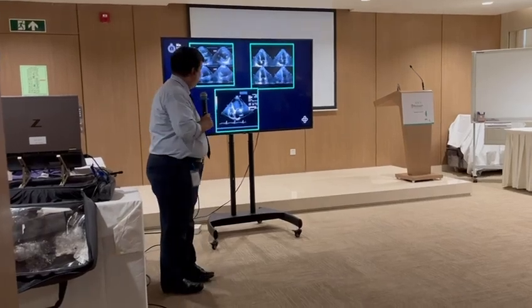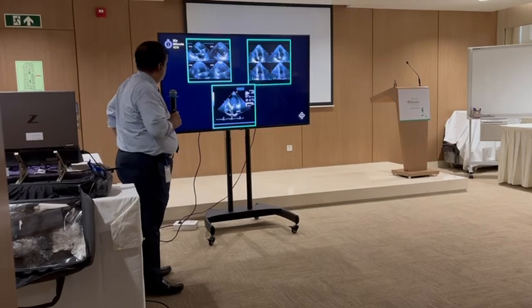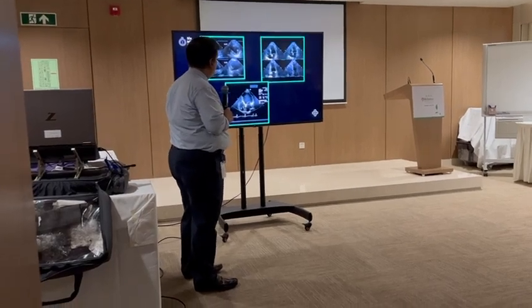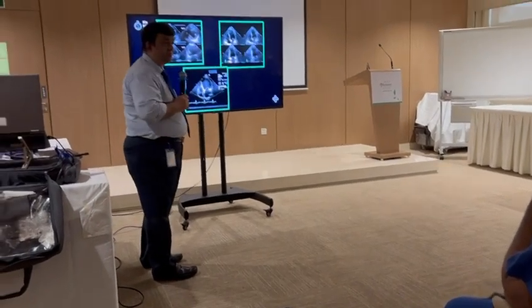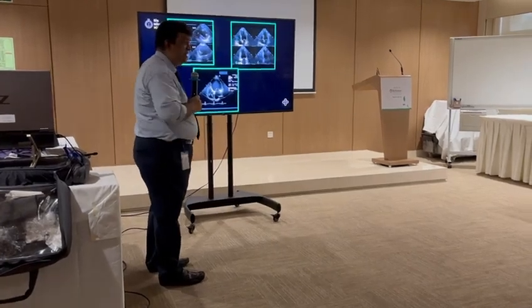Okay, tell me. This one, good, moderate or poor? Poor. That is poor, accepted. What is that? Yeah, so that looks pretty okay, isn't it? The contraction looks okay. What about this one? Severe. Poor? Okay. What else can you see in that video?